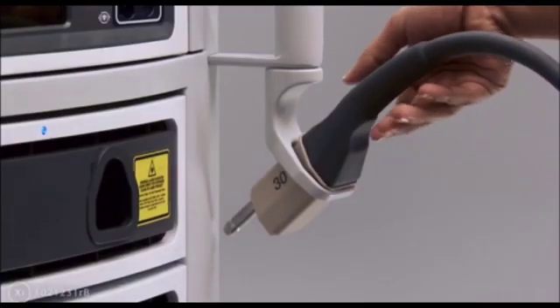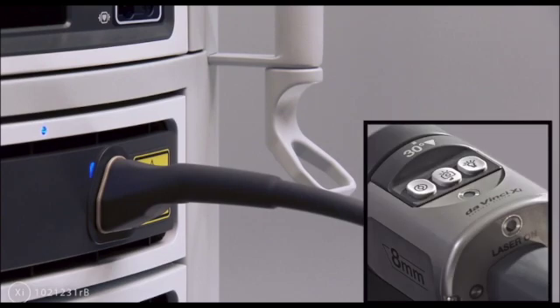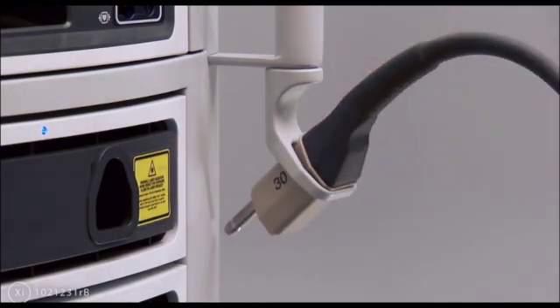The endoscope connects to the front panel of the endoscope controller. Once connected, it automatically self-calibrates and adjusts its white balance. When the endoscope is ready for use, a solid green LED will be displayed on the endoscope. When not in use, the endoscope connector can be stored in either of the endoscope connection holders.